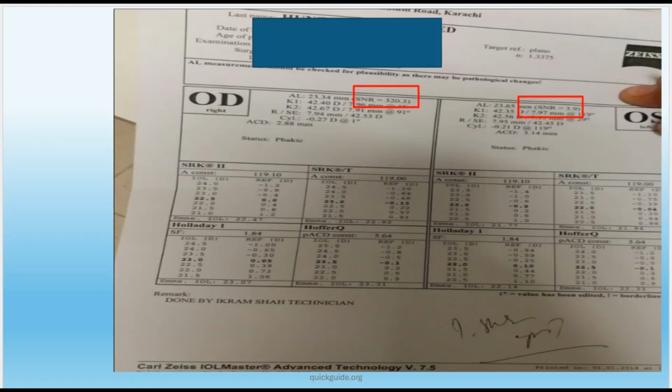Now, one thing that we need to remember is that a measurement is good as long as we can validate it. We have to validate the measurement, right? Whether you'll be going with the axial length, K readings and all, even before you look at them, you need to see how you can validate the data.